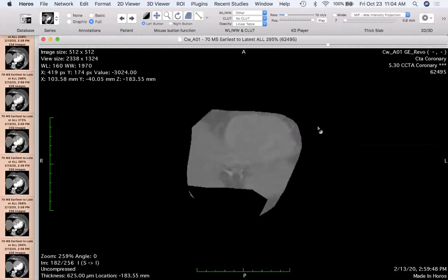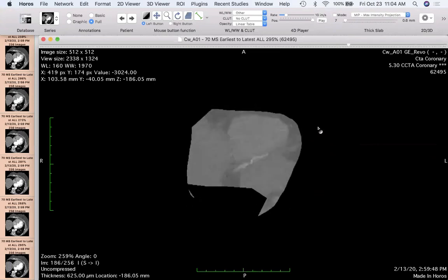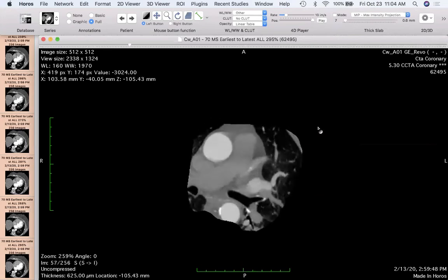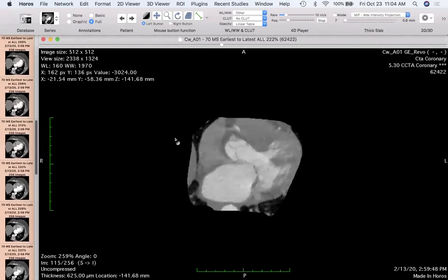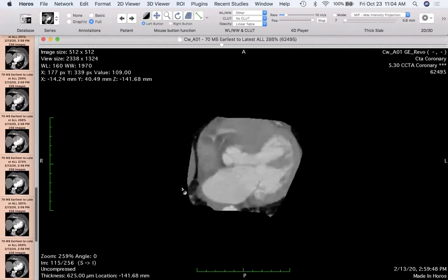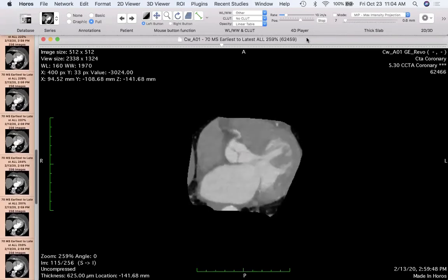Now, interestingly, what has happened is when we did that segmentation in the 3D space, it seems to have mapped it back here to the 2D space, right? Which is kind of cool, right? Let's see if it's mapped it back to time frames. So if I hit play, yes, it has, right? So now, I'm not sure, but I might be able to save all of this data with this segmentation intact. You guys should try that. I'm not sure if that works, to tell you the truth.